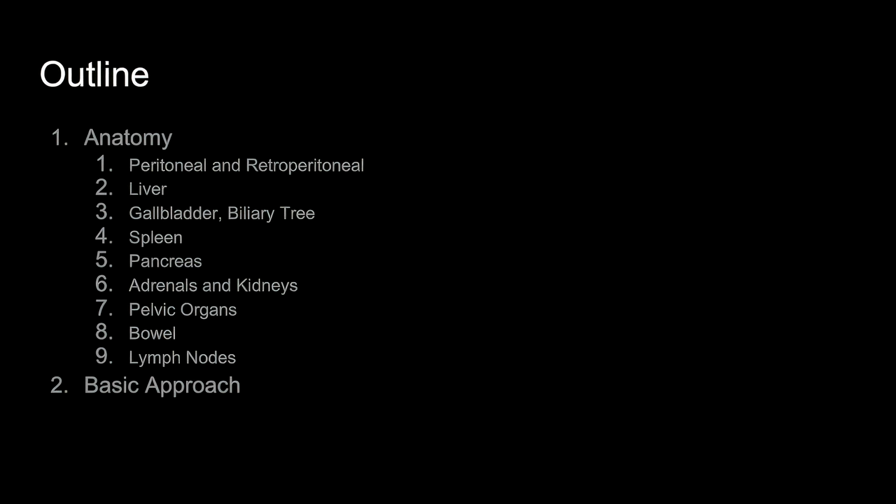watching this video. In this first video, we're going to focus on abdominal CT anatomy, mainly by scrolling through a normal CT of the abdomen and pelvis as well as some cases. We're going to focus specifically on the most clinically essential anatomy, namely the things that you need to know before you're looking at an abdominal CT scan efficiently.